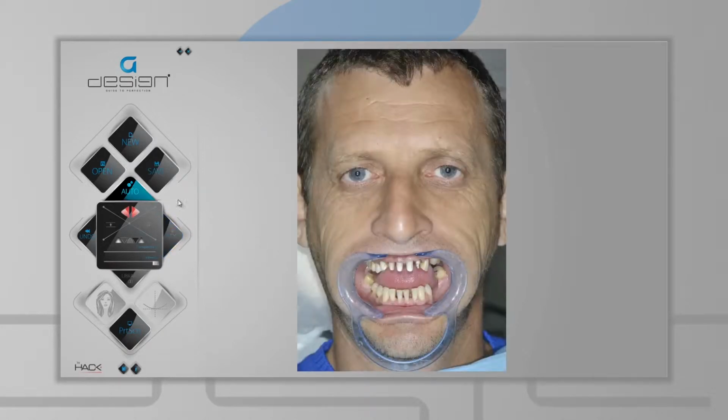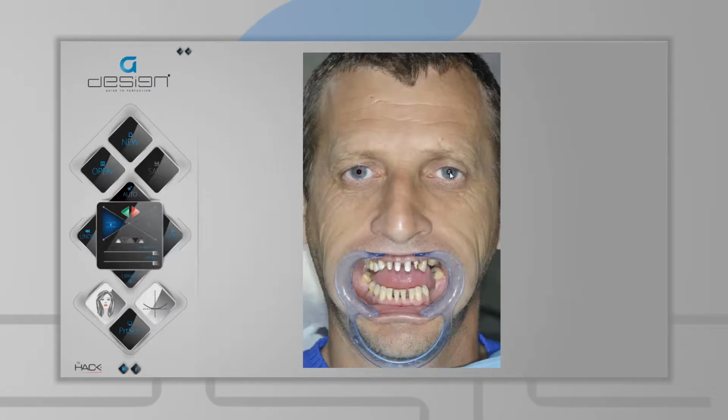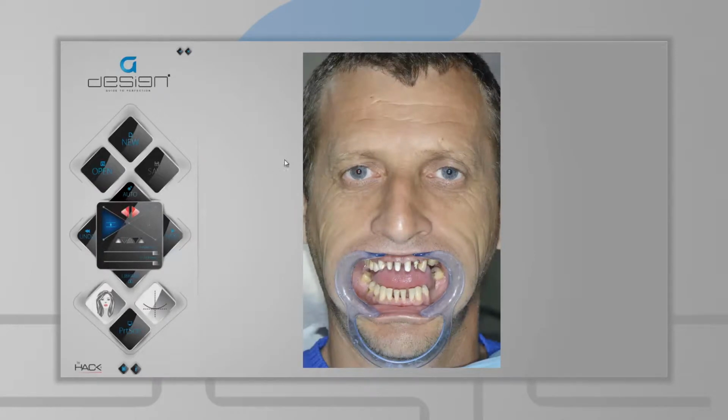Press Auto for automatic detection of the pupils. The two symmetrical points that mark the pupils can be set manually if the user prefers to do so. Once the pupil marks are set, be it automatically or manually, the two buttons on the left corresponding to them will light up green. Resetting those marks is also possible by simply pressing the respective buttons, which will then light up red.